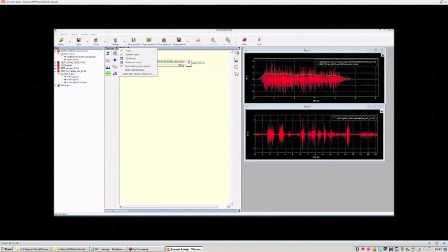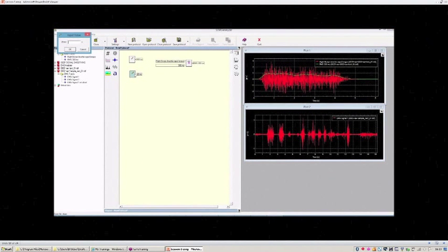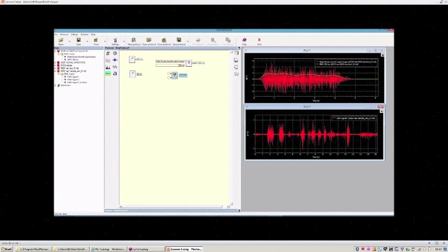For the second signal, I can choose a different time window. For example, I will choose 20 milliseconds, so 0.02 second. Again, we have to select root mean square with mobile window algorithm, and the first input again has to be the raw signal, and the second the duration of the time window.